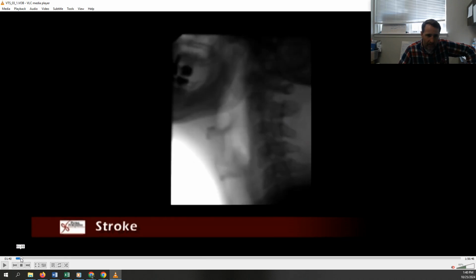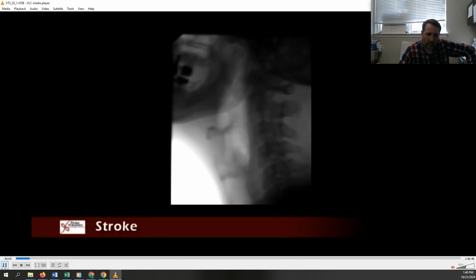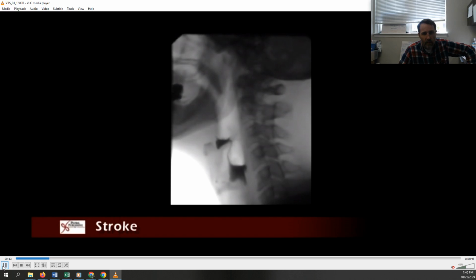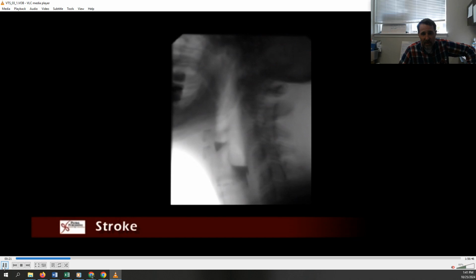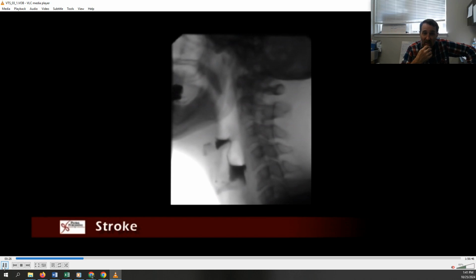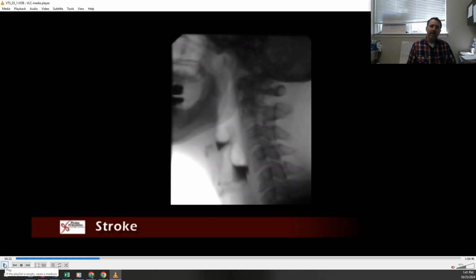Let's go back, see if I can get this to play again. All right, so 1, 2, 3, 4, 5. He's either got a very long delay or that squeeze is his pharyngeal swallow, and it's not doing much of anything. There's the aspiration. So what are we seeing in this guy?